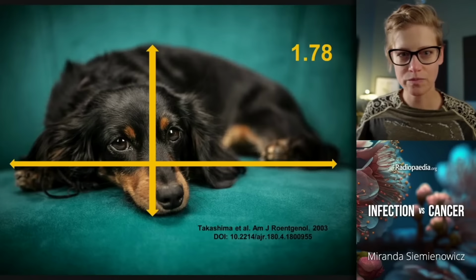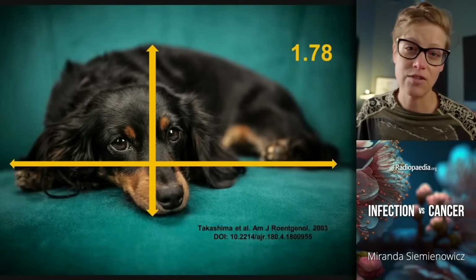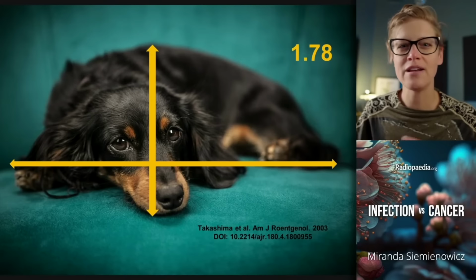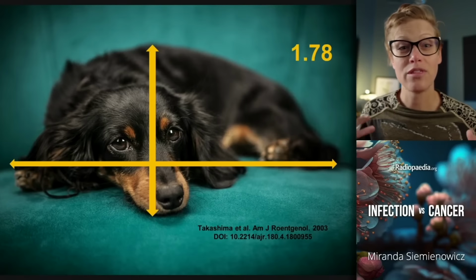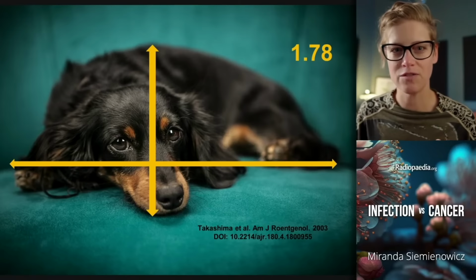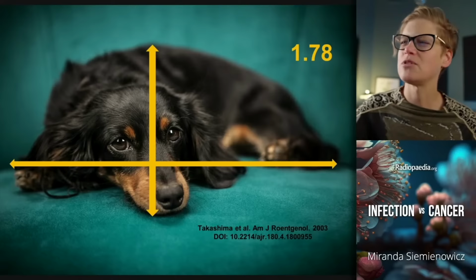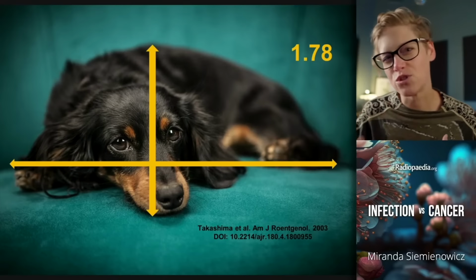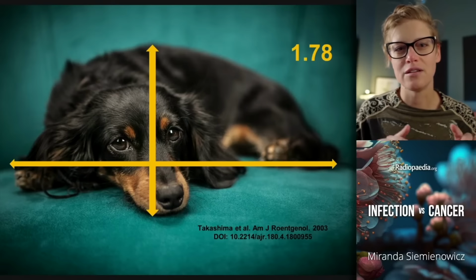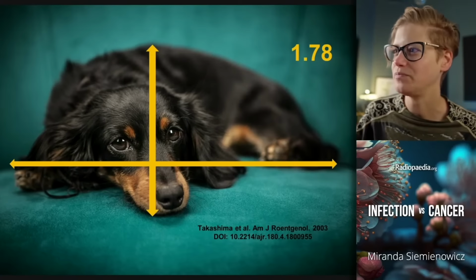it is tall. This is taken from a historical paper from 2003 that examined 72 small lung nodules, 40 of which of them were benign, and came up with this ratio of 1.78 as being 100% predictive of benignity in that nodule group. Subsequent papers have used descriptors such as flat or sheet-like, and all of this is pointing back towards this being the shape of benign lesions in the lung.